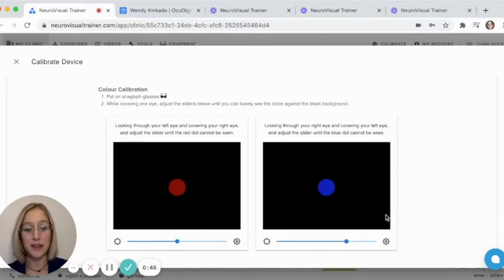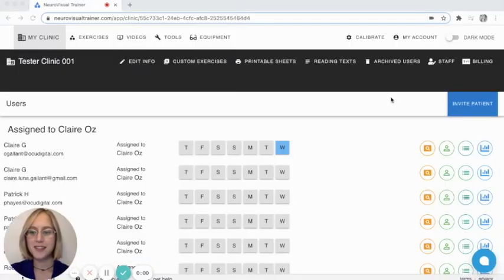And same thing for the blue over here. Next up, something that you can do is also to invite yourself a tester patient. So this is actually going to be you. If you have a personal email, this is the perfect thing to use here.